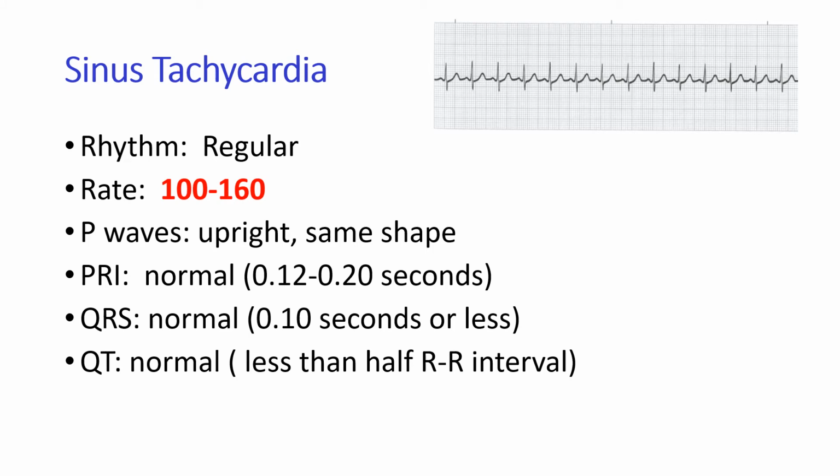Sinus tach. Usually the stress of the body will be reflected in a sinus tachycardia. It's the normal physiological response to something going on. The normal response of the heart, when the body demands an increase in blood flow or oxygen, is to increase the heart rate. The SA node will gradually increase its rate in response to the needs of the body. Then it will decrease after the needs are met. It begins and ends usually pretty gradually.